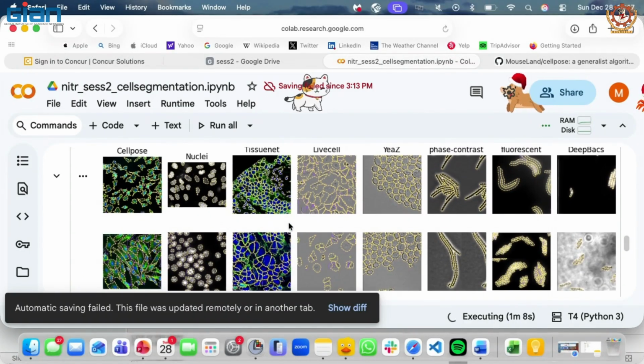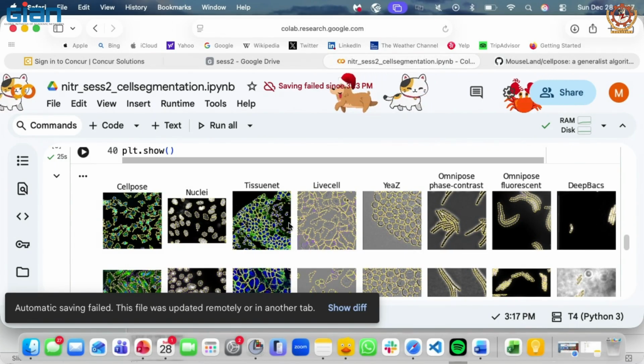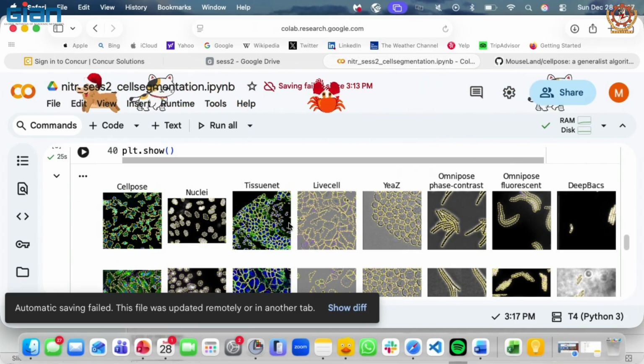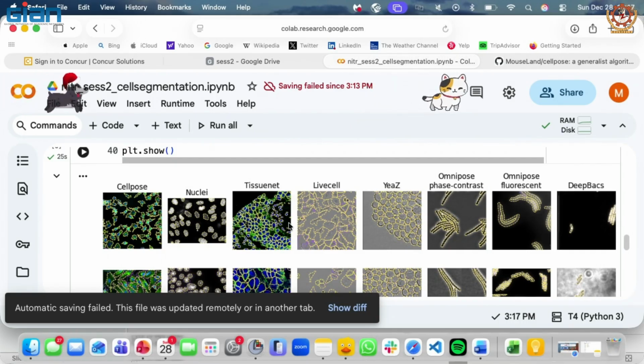For live cells, the cell is moving, or the cell is growing. In order to understand the movement, what's the movement of a cell called? I think the term is cytokinetics. Sorry, what? Motility or something. In order to accurately measure it, you can see it with your eyes, but if you want to quantify it, put a number to it. Okay, what's the rate, motility rate, or movement rate, or growth rate? There has to be a number. In order to put a number, you have to quantify it. So the first step is the cell segmentation.